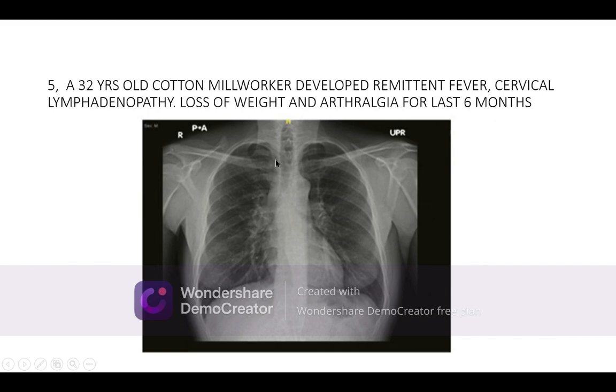I have seen this type of lymphadenopathy in coronavirus also, in an acute condition where there was viremia going on, causing bilateral lymphadenopathy. So anything which is causing bacteremia, or viremia, or rickettsia, or mycoplasma, etc. will cause bilateral lymphadenopathy. But specifically speaking, the paratracheal group and cervical group are involved. This type of picture is more focused on the lymphomas. So lymphomas are the most probable diagnosis.